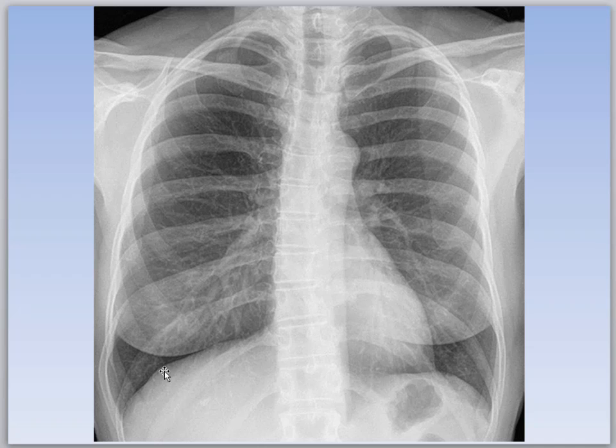Hemidiaphragm is here. Okay, what are these things right here? See another shadow coming around. One's here too. Those are the breast shadows. So this is obviously a female.